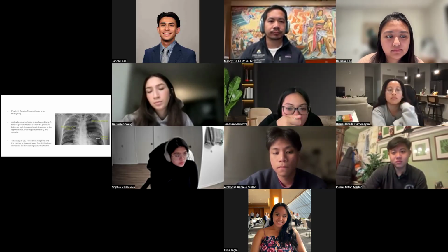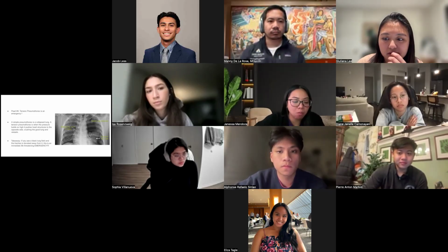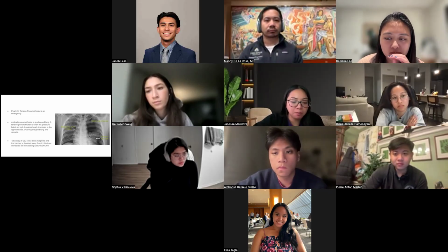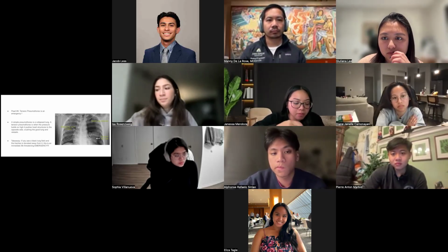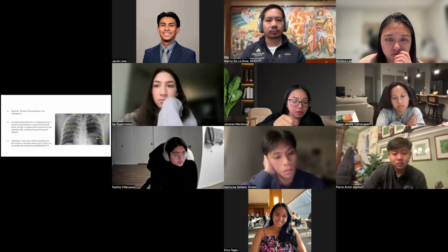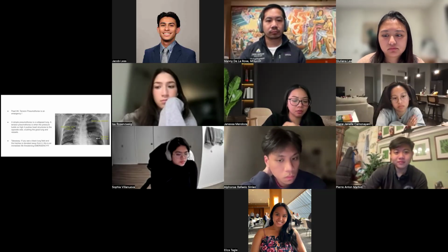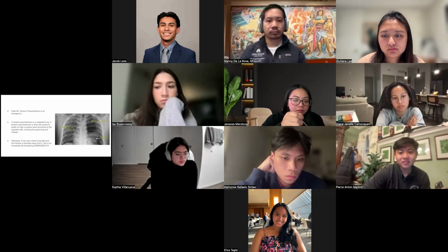So tracheal deviation plus pneumothorax, right? That's tension, that's pressure building up. That's why it's called tension. For this one, if you see that black lung field with the tracheal deviation, again, this is a life-threatening emergency. And as Kuyamani mentioned in the chat, it's an immediate indication, with hypoxia and hypotension, to put in a chest tube or talk about needle decompression.